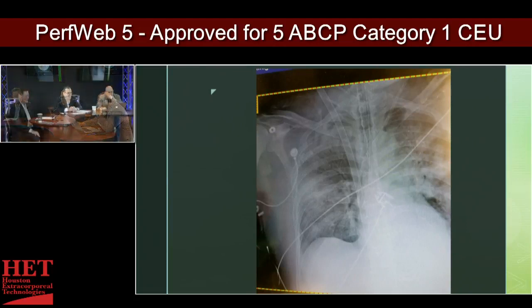And what am I looking at? If you're not used to looking at these, or if you don't have a systematic way of looking at this thing, this is a very overwhelming picture. You have no idea what you're doing. This is kind of a Where's Waldo? You're trying to tease out some things, and you're going straight for the gold, but you miss all the other glitter that's around it. So this is obviously an intubated patient who's been initiated on ECMO.